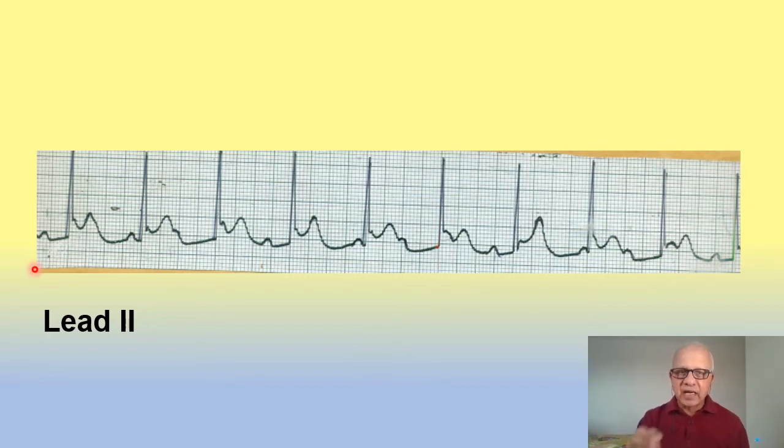The patient had a classical triphasic pericardial rub heard in the precordium, and this turned out to be due to tuberculous pericarditis on later investigation. Okay, and he was treated, he became better. So the changes of pericarditis are noticed in almost all the leads, except maybe leads like AVR, sometimes V1, right?